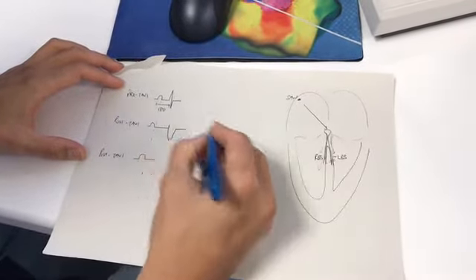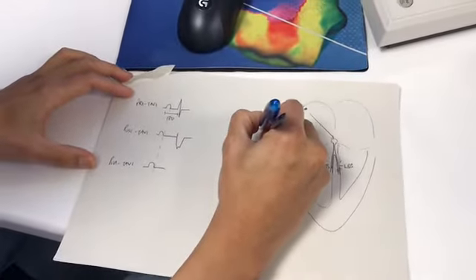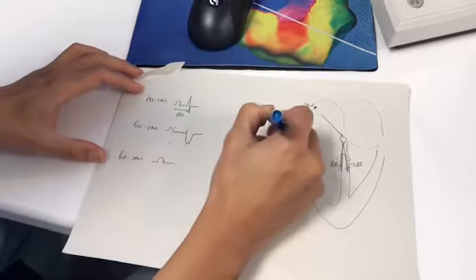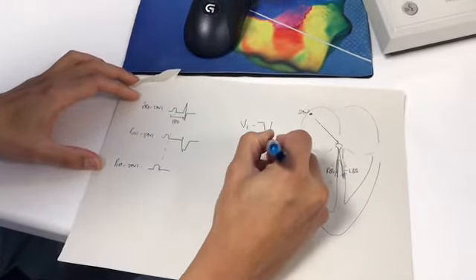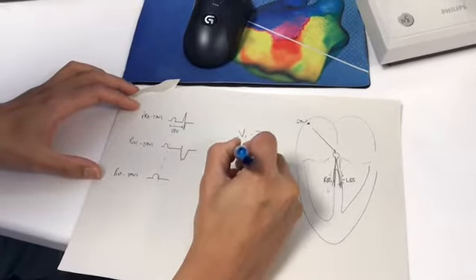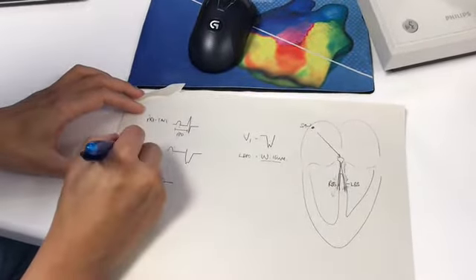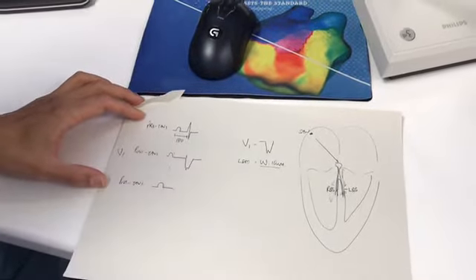And this gives you in lead V1 the sign of a left bundle branch block pattern, which looks typically like the famous William and Marrow of a left bundle branch block. In V1 you get a negative deflection, and if this is V1, this is what we might get.